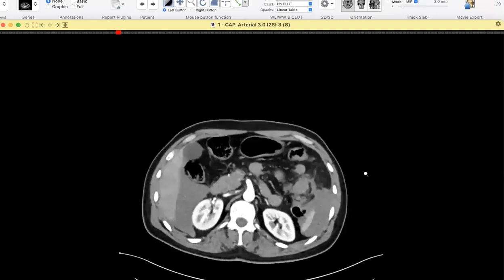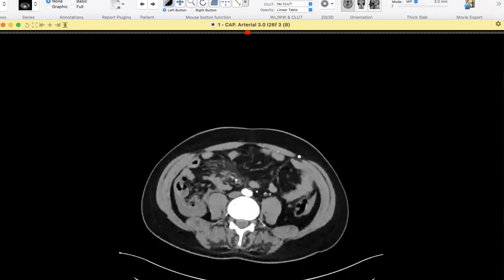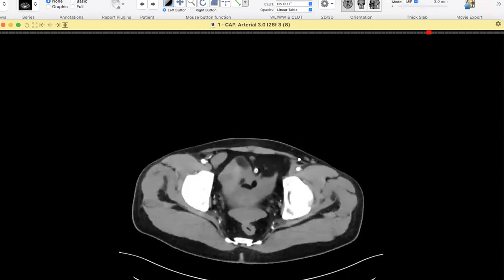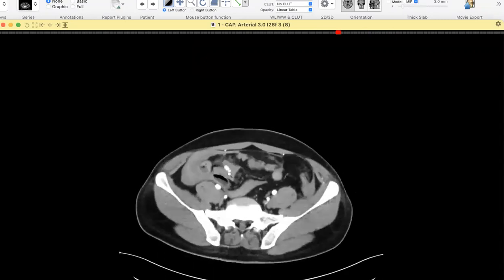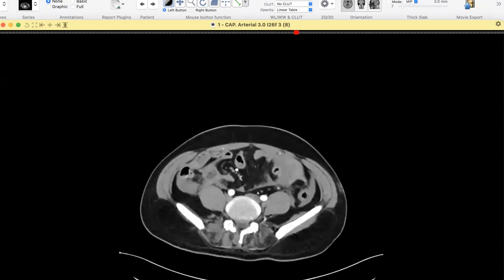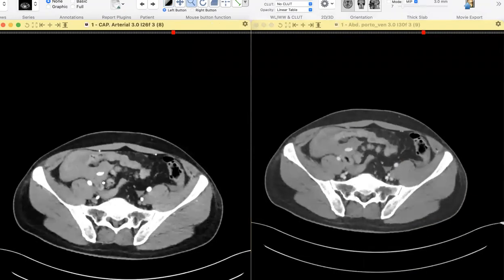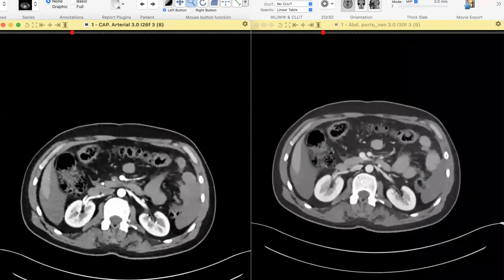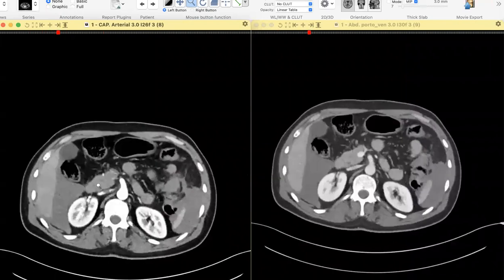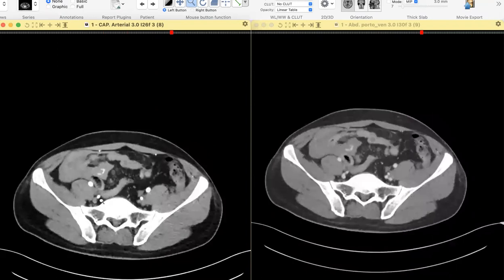Yeah. Okay. This case, where's the external iliac artery? The external iliac artery is down over here. This is one of the branches of the superior mesenteric artery. So this signifies a mesenteric tear. There's active extravasation of contrast, and when you say ascites, yeah, it was very near to that external iliac artery, that just took a while there. Yeah, so this is the external iliac artery.